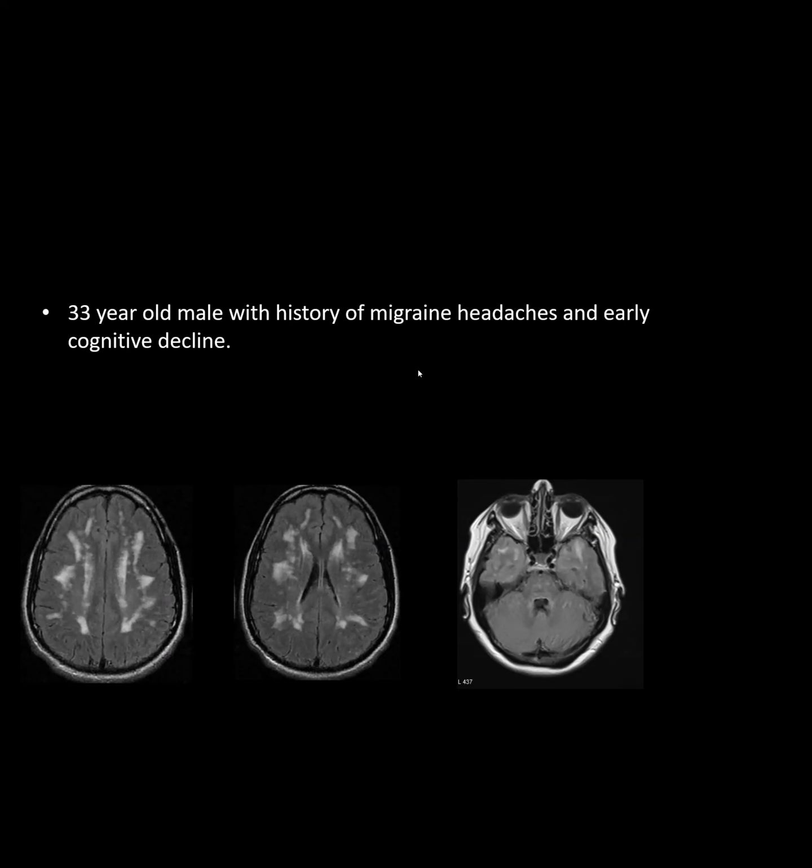Right. Demyelination is another possibility for this patient. That also likes to go to the anterior temporal region, in addition to the other areas that MS and things like that like to involve. Given a younger person with the right history and anterior temporal lobe involvement, like you're seeing over here, that's a good appearance for CADASIL.